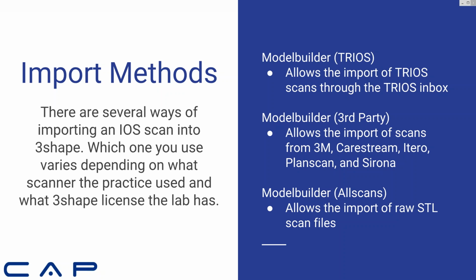I have a question about skipping the crown design. You don't necessarily have to complete any design on a case before you go into Model Builder. You just have to go into design and get up to the insertion direction step. Once you're at that step, you can save and X out, and then you're able to go right into Model Builder without doing any sort of crown design.